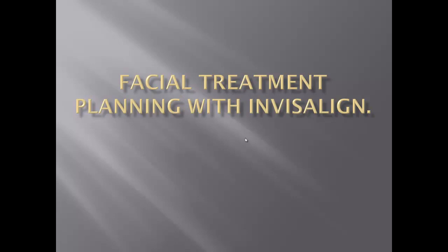Today I would like to discuss with you facial treatment planning with Invisalign. This case is not finished yet, it's still in process, but I want to go over the details, how I would approach this case step by step. It will be helpful for everyone who has to approach most difficult cases like full rehabilitation cases, even the simple one tooth procedure in your office.